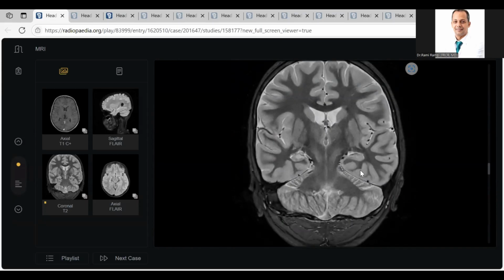Sir, there is a bilateral altered signal seen in the thalami, extending down into the superior cerebellar peduncle. Doctor, you have some echo in your voice.